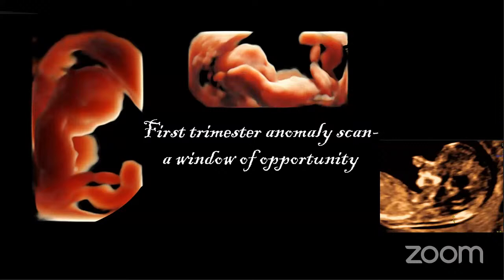Now, my topic of discussion today is the first trimester anomaly scan, a window of opportunity. Now, Sachin has very well explained to us how we do an NT scan, the NT image and the CRL image. But now I would really want to stress another point.